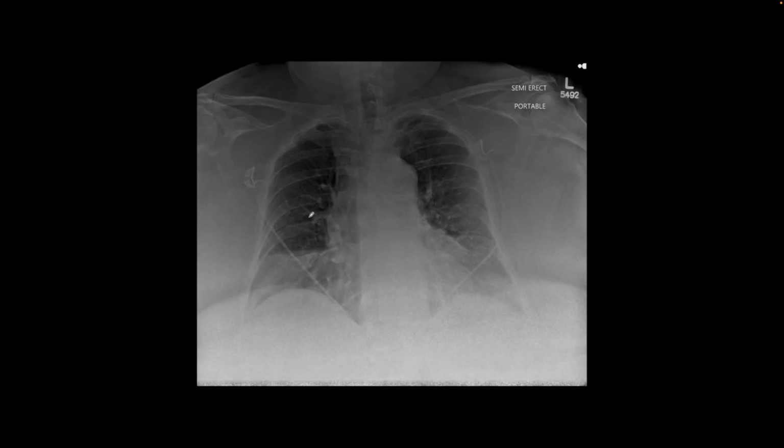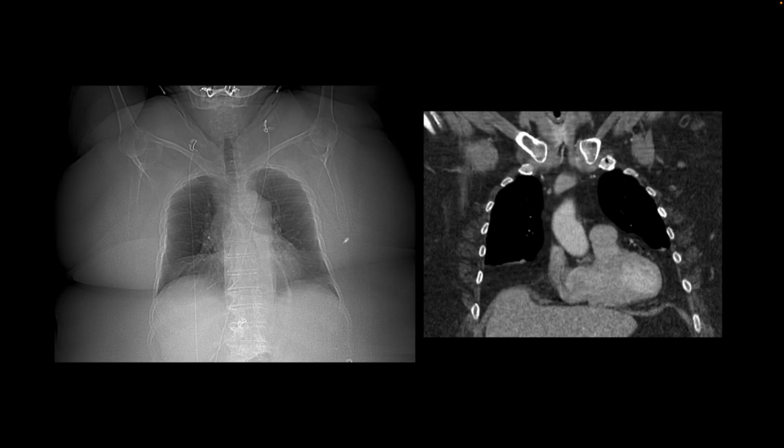This is a chest x-ray showing a large patient. We see a lot of soft tissues, and we see this paracardiac density on both sides, and this is also seen on this scout image from their CT. And again, we see this very large patient, probably 500 to 600 pounds, and this is paracardiac fat pad that was seen on the chest x-ray.